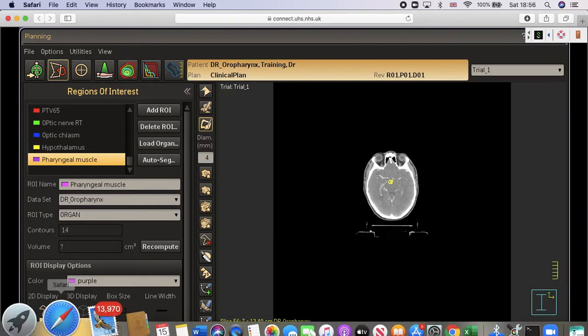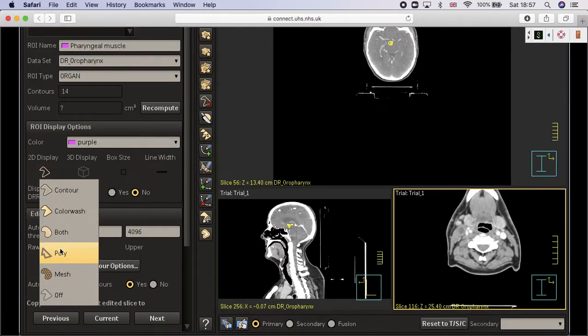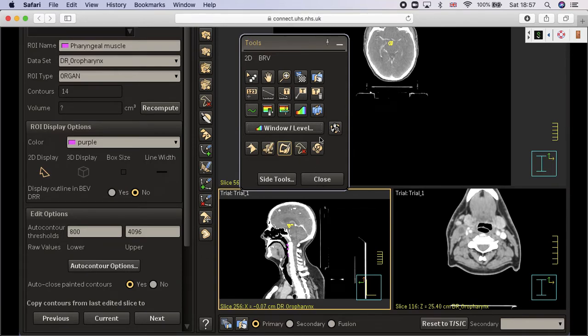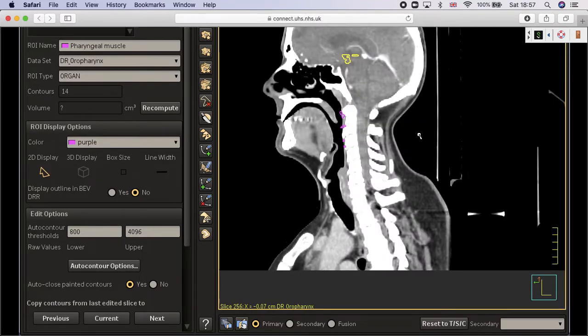Okay. As I said, I'm trying to simplify things as much as I can, but maybe you are not very satisfied with that. Just use the MRI then in doing it. It will be there. You can see it, and it's very easy to localize.